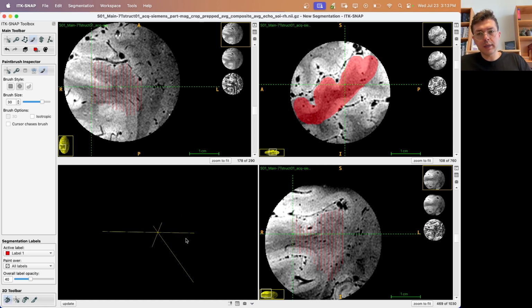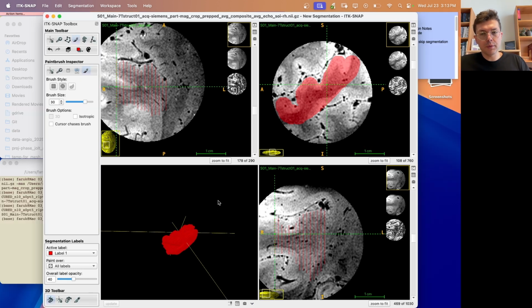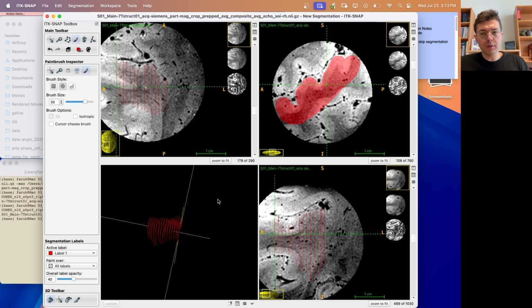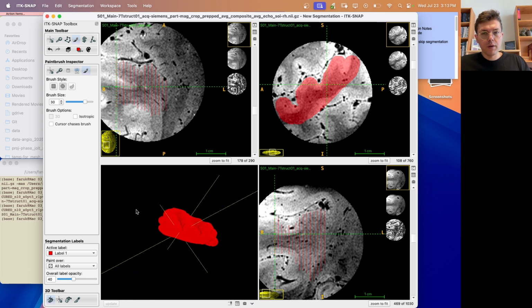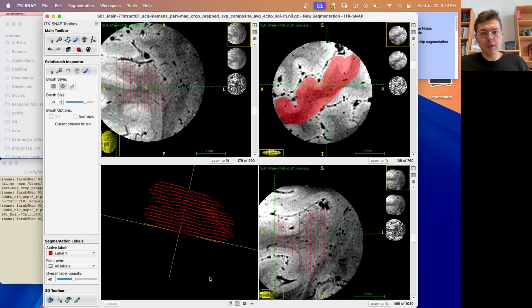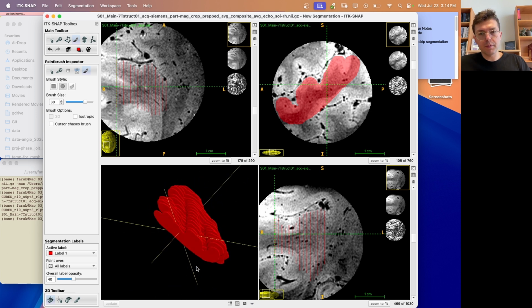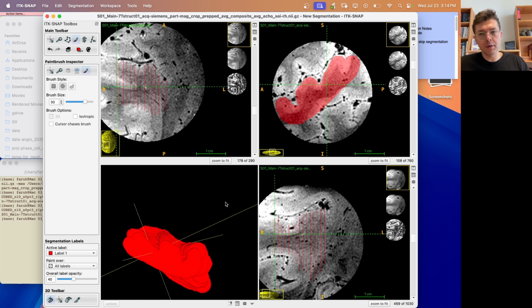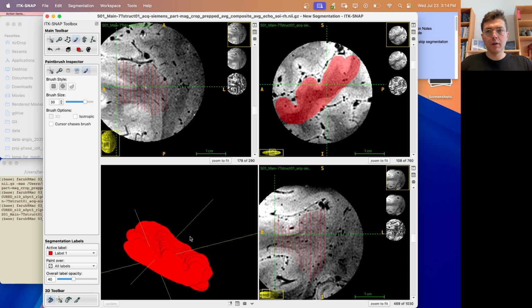And the other nice thing is that once you have a couple of slices and you update, you will actually start seeing the geometry of what we are doing. And in time, this will make more sense. I mean, you can already, or people who spend time on Heschl's gyrus can notice that this is the medial part, this is the lateral part. You can see that it's splitting a bit. And we are filling in roughly these areas.